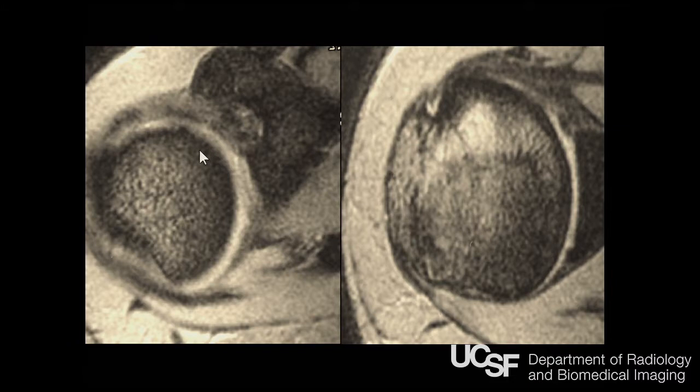This is an MR. On the MR images of the shoulder, the top two images of the humerus should always be perfectly round. Below that, you're going to start getting into the greater tuberosity and the trough between the greater tuberosity and the humeral head. But this is not perfectly round. This is a Hill-Sachs deformity, and it's going to be in the posterolateral corner.